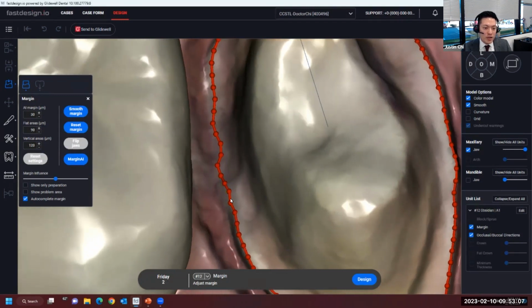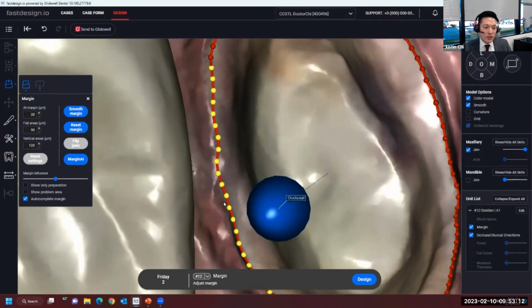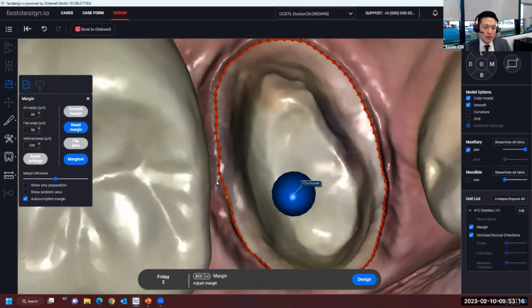It kind of starts jumping around, and maybe the margin's not the smoothest either. But I'm going to go ahead and make a little change here. And just to show you the second way that I can edit the line, I can double click on the line and then just draw. I'm going to actually move it off here. It's a little too close.